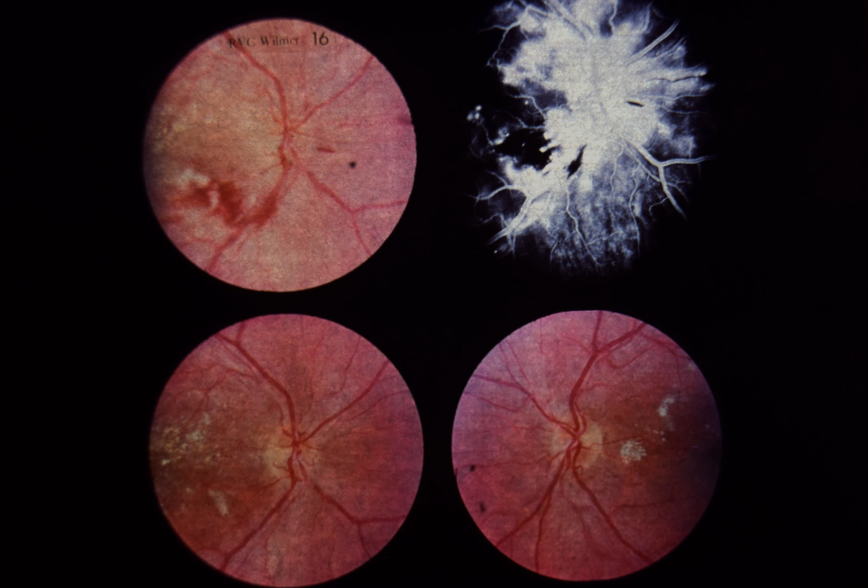Lower left and lower right. 6 weeks later, there is marked resolution of the retinal hemorrhages and the optic disc edema, but hard exudates persist in both eyes. The optic disc edema in severe hypertension with and without encephalopathy is usually not associated with increased intracranial pressure, and the term papilledema should not be used in this setting. The edema is probably due to local vascular changes associated with severe systemic hypertension.